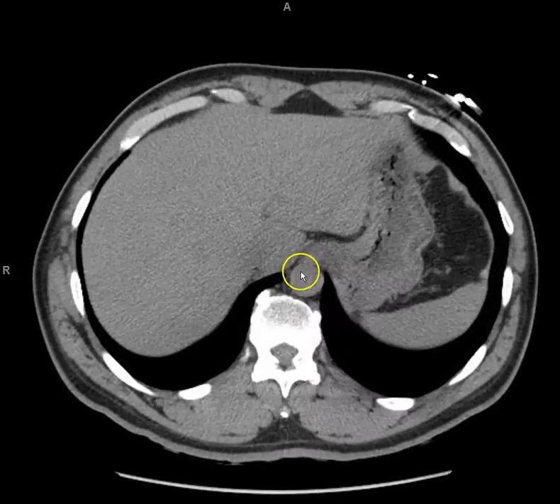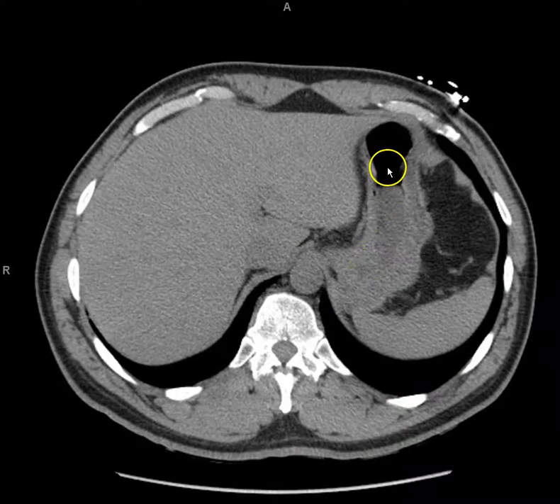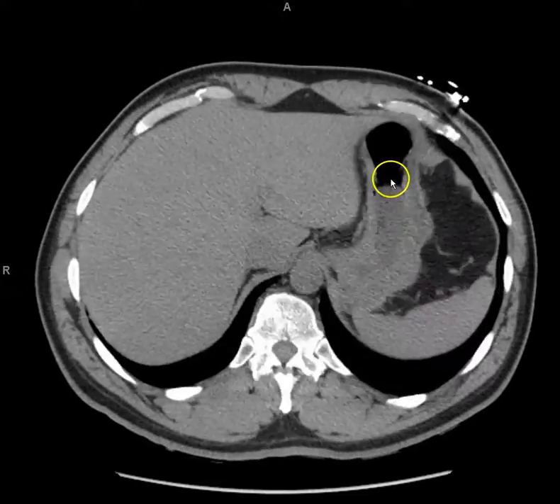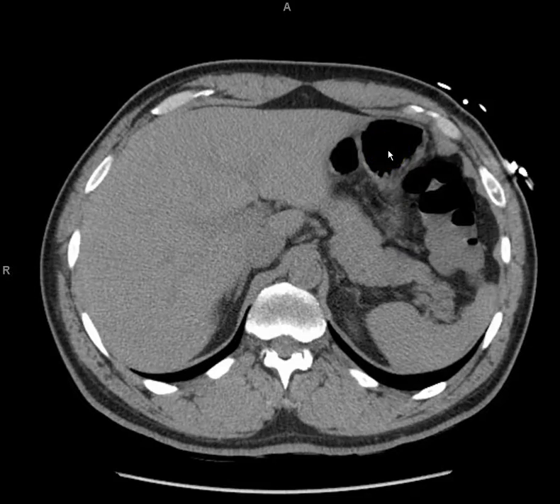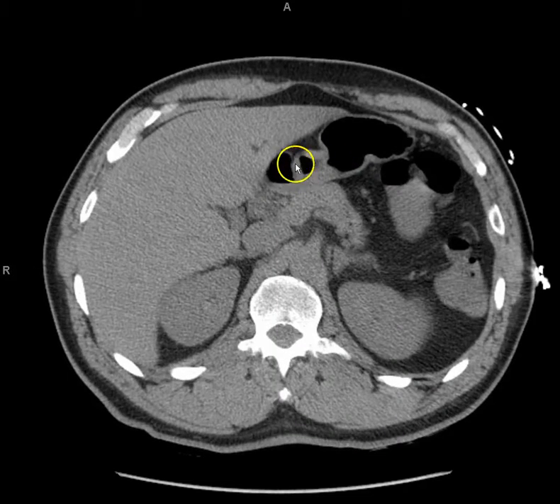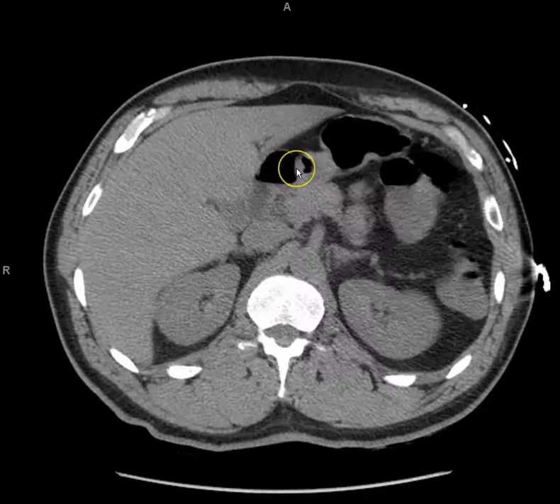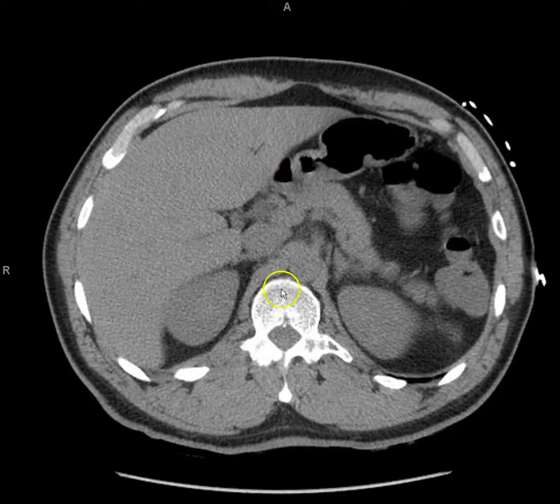Now, as we follow this esophagus, what is this organ that it attaches to? Yes, the esophagus always attaches to the stomach unless it's surgically abnormal. So that is all stomach. This thickening here, which looks like a ring kind of. Pylorus, excellent. And the pylorus typically is midline.